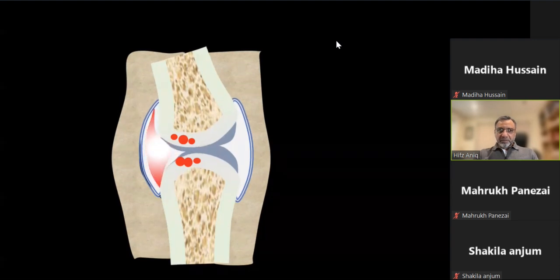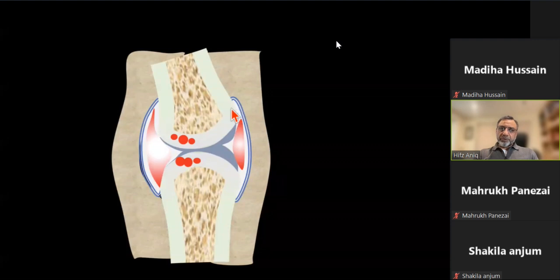and when it's inflamed, it leads to erosion. That's osteoarthritis, because osteoarthritis came first, leading to inflammation of the synovium, and the inflamed synovium now causes erosion. This sequence we call erosive osteoarthritis, and it's completely reverse in primary inflammatory arthritis, where the inflammation of the synovium causes erosion of the cartilage, leading to osteoarthritis. We call it secondary osteoarthritis.